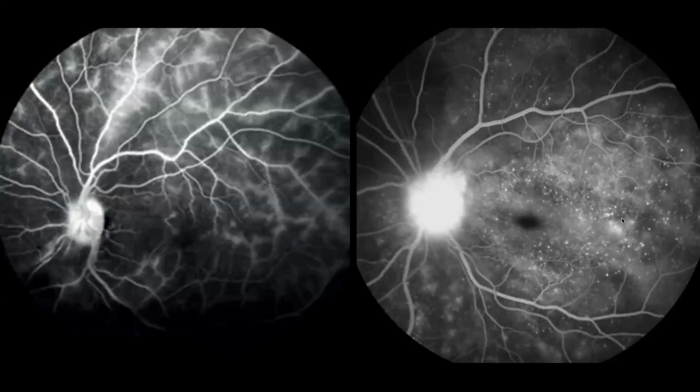So yan yung choroidal inflammation. But kung ICG yan, you would find specific foci of inflammation that would appear hypocyanescent. Okay? So that being said, FA excellently images retinal vasculitis, but yung patterns for choroidal inflammation or choroiditis, medyo vague yung itsura niya.